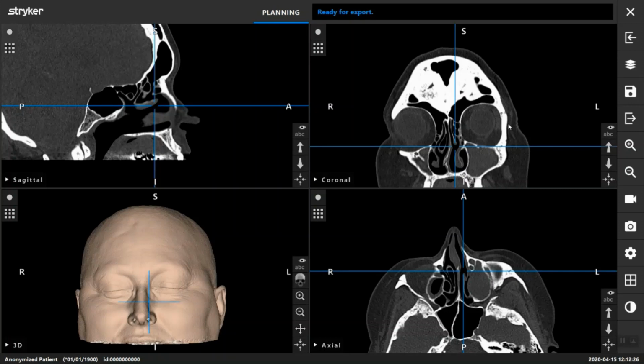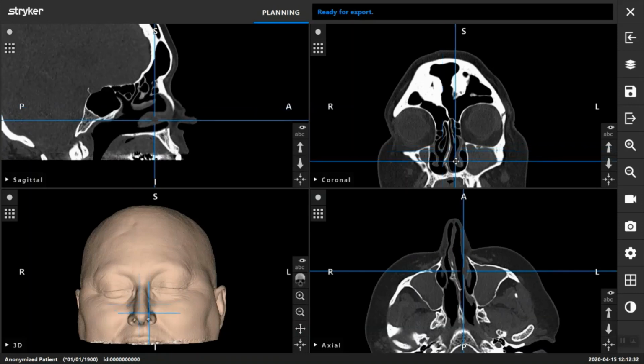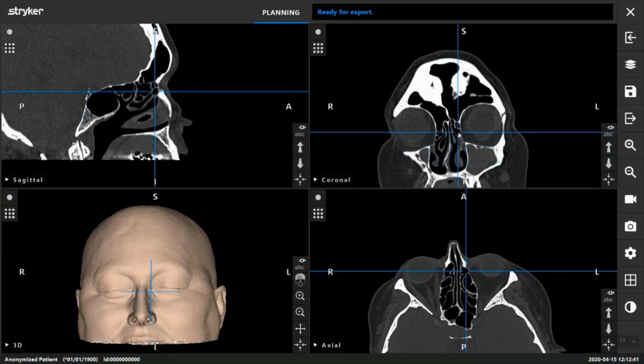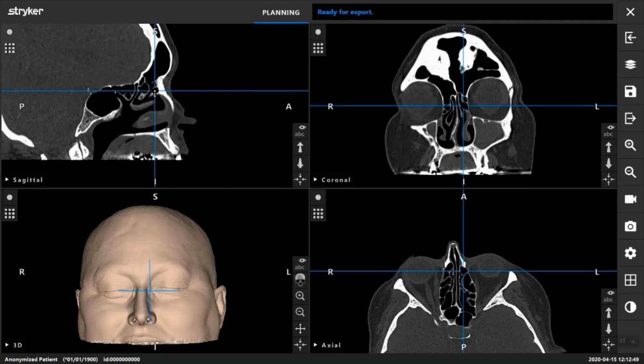So we just talked about the frontal recess anatomy. On the left side, let's take a look here, at least initially, at the anatomy. And you're going to see that we've got a stack of cells here. A lot of times I like to try to find the agger nasi right off the bat. You can see that as we look on both the sagittal, you see the agger right there, and you see it here, right next to the nasolacrimal.